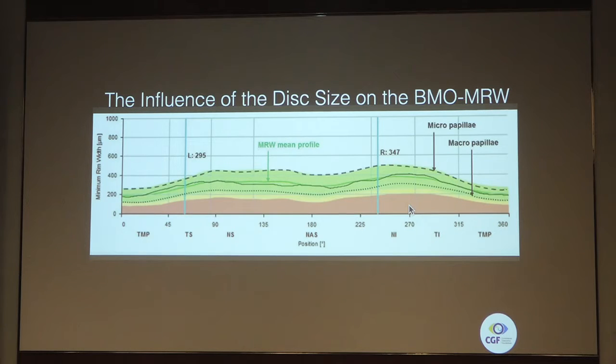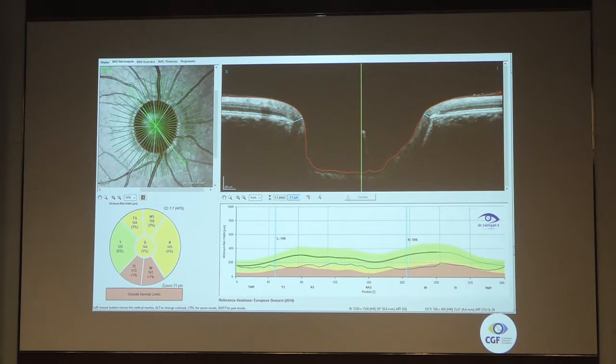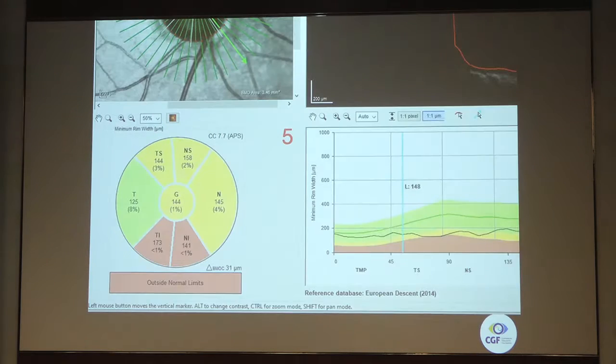So this is one thing which you will have to understand. Sometimes when you see this is down, you should not think the patient is having damage. At the same time, when the micropapilla is arranged here, then you should understand that there is something going on also. This is the same thing which I was just trying to discuss, how you can really look at the localized area of damage. And this is the same line which I was just describing.